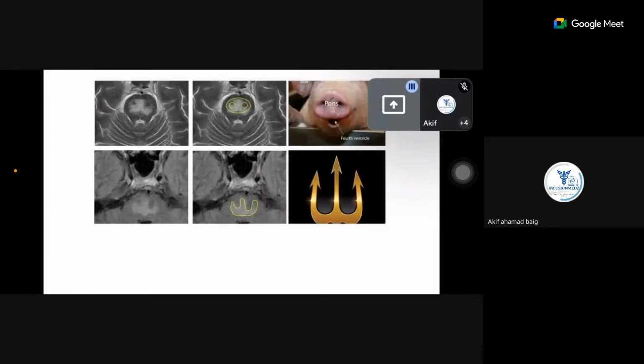Okay, here I've given the clue also. What is this? General medicine candidates tend to treat this in some places. When you're on night duty, you'll get to see someone with hyponatremia and you'll aggressively correct it. Central pontine myelinolysis, osmotic demyelination syndrome or CPM. And what sign is this? This is one of the most debilitating after effects of aggressively correcting sodium. The patient will be in a locked-in state for life.